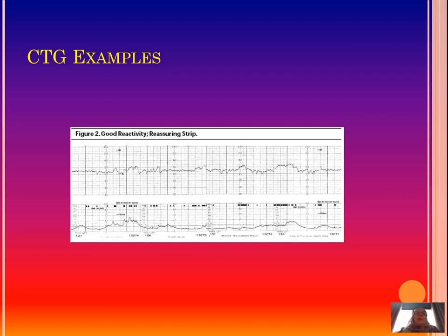So if we now look just at a few examples of CTGs, please take your pen and paper and follow Dr. C. Bravado and explain this CTG. I give you a couple of seconds for that.